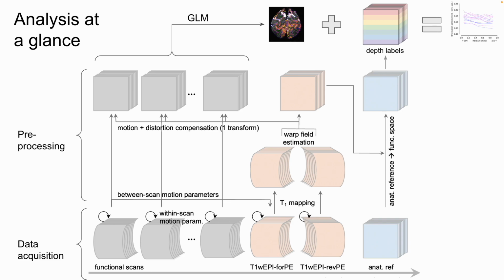I've got them because you can just walk up to a scanner, turnkey, put a person in, get an MP Rage, and feed it into FreeSurfer. You don't know anything about what's happening in the box in FreeSurfer, and out the other side comes a really adequate looking segmentation.